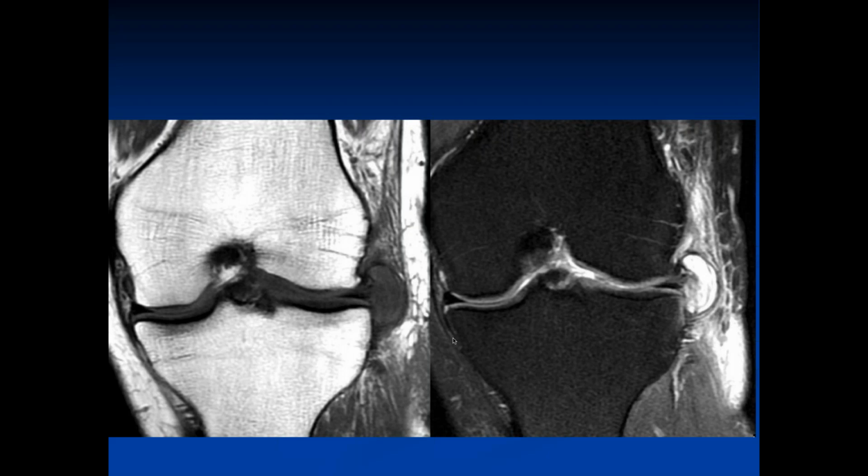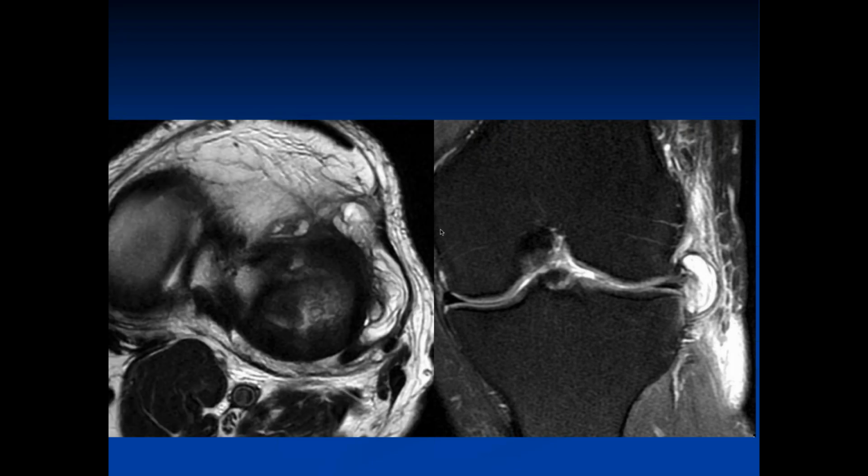Okay, so we have coronal images of the knee. It looks like we have this large cystic structure protruding from the lateral aspect of the body of the meniscus. Just a large parameniscal cyst. What would you do with that? Well, I guess it means there's a tear and that there's joint fluid going through the tear, forming the cyst. So, I don't know if you do meniscal repair.